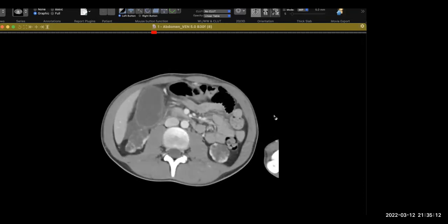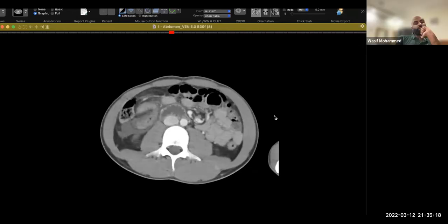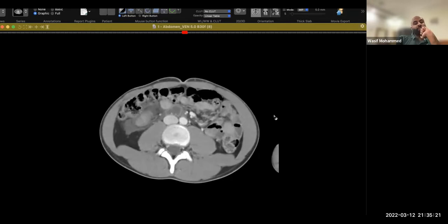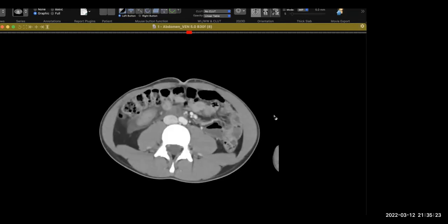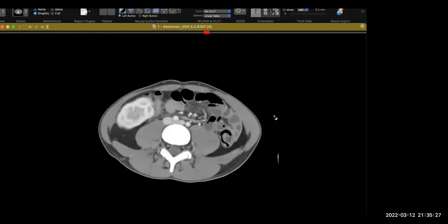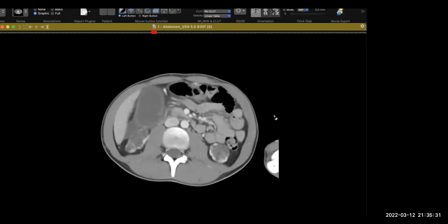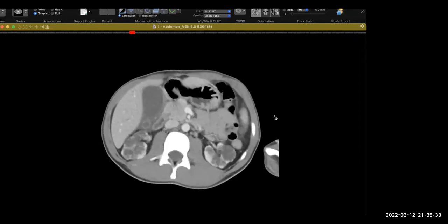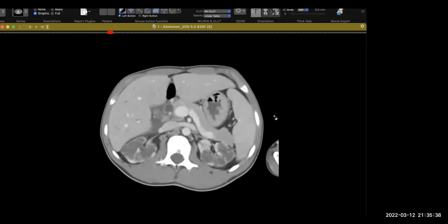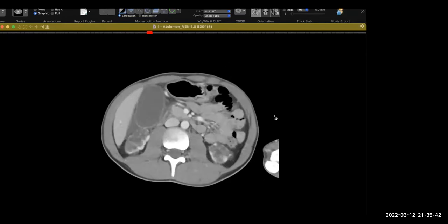I would like to inquire about the presenting complaint of the patient, since the patient has a chronic medical condition, but currently is complaining of right hypochondrial pain. All right, yeah, I could see some free fluid in the right hemiabdomen and I'll try to ascertain the associated cause. So the gallbladder is distended with surrounding free fluid. One of the possibilities could be an acute cholecystitis.